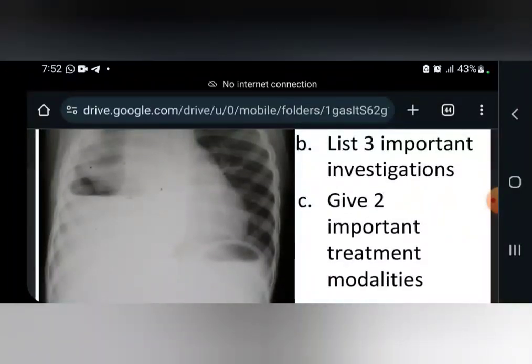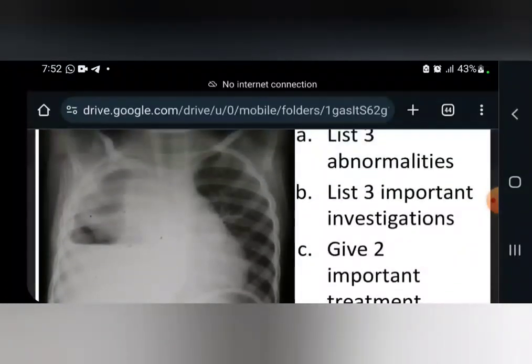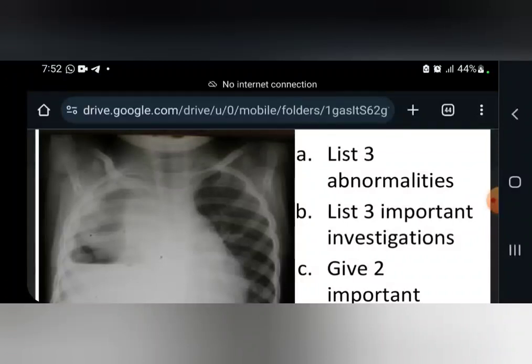Every time that you visualize blunting of the costophrenic angle, it is normally associated with what? A meniscus sign. And the meniscus sign is just like a downhill. When you put water in a small test tube, you realize that the water has a downstroke. Is it clear? It's as if it's going downhill. That meniscus that you see since chemistry, that you were doing in the laboratory, putting your test tube in a beaker until they were telling you that that inferior point was the part that you should measure. Is it clear? That one is the meniscus sign.